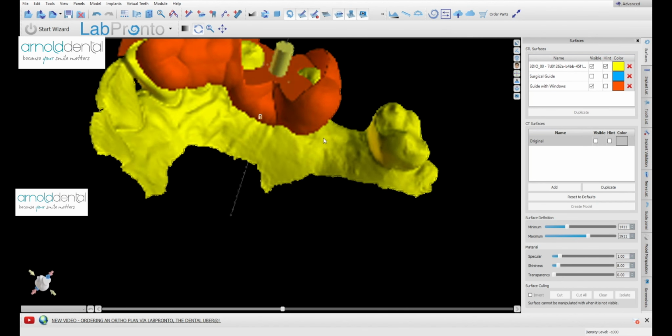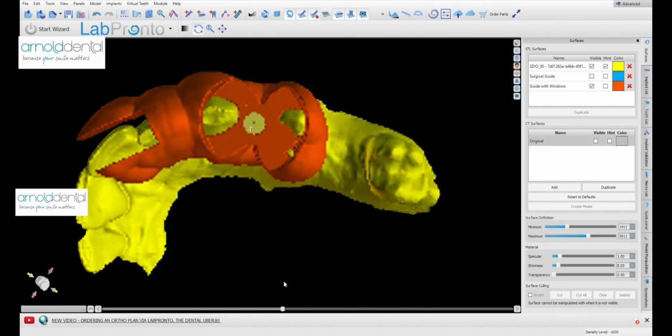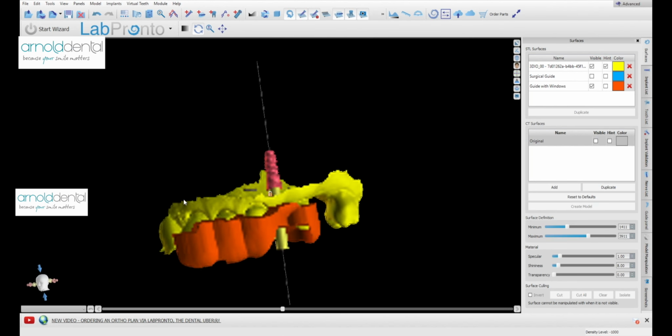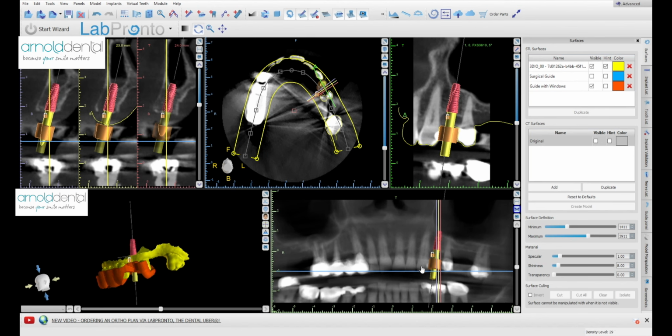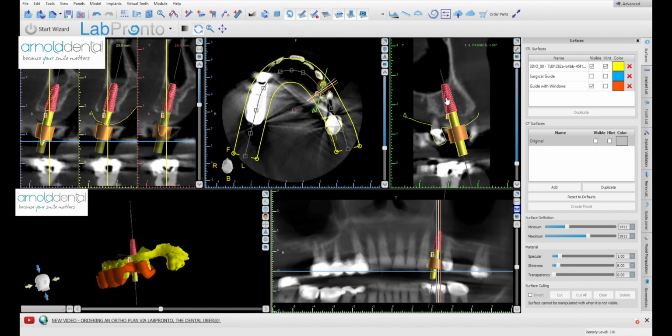And that's going to give us the initial pilot hole, which is going to guide the implant through, get us in the right direction. I'm just going back now, just checking all the stages. Do I want to change anything? Is there anything I'm questioning? But otherwise, that drill guide is good to go.